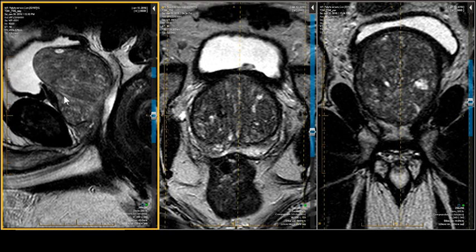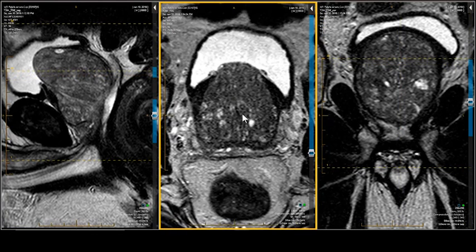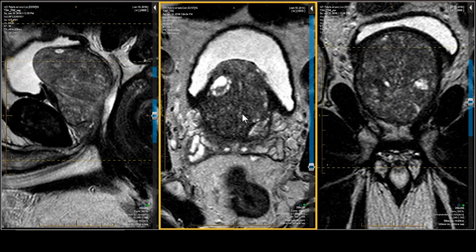Type 3 is when they're balanced. This is as big as that, and the urethra doesn't move. And type 4 would be pedunculated or lobulated extension into or invaginating the urethra, often very difficult to see unless you have high-resolution imaging. So this would be an example of a type 2. Now, in the axial projection, that's a little harder to discern. You might be tipped off to the fact that it's the CZ or central zone or posterior gland that's markedly hypertrophied because there's so much enlargement as you go up to the prostate base.